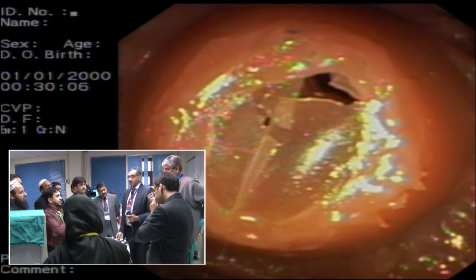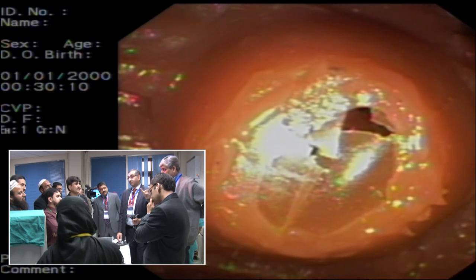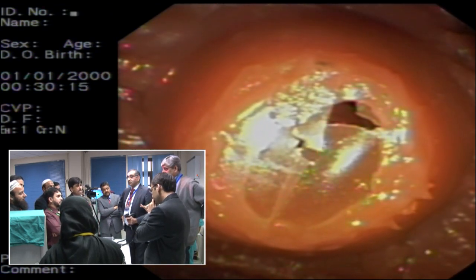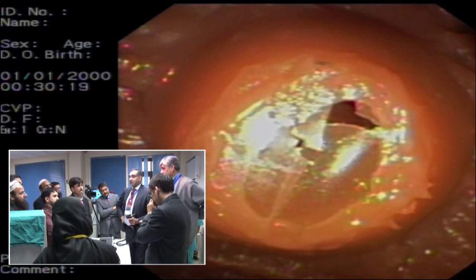You are young and energetic. You're young and you don't think about it. And so I think radiation exposure is important. Back protection is very important. Don't get too excited, and just because you want to do it, don't compromise on your bed levels and all that.